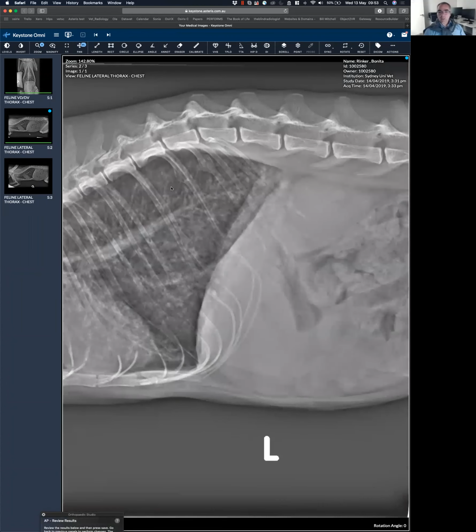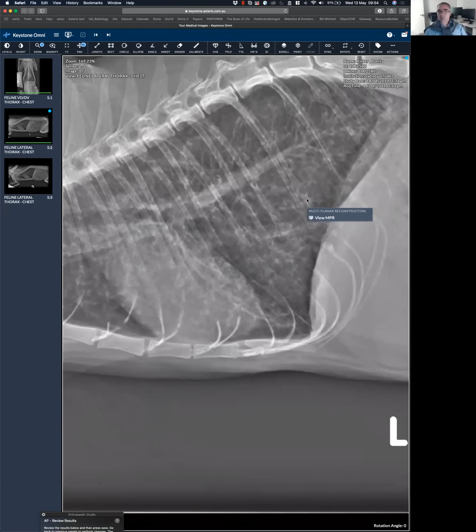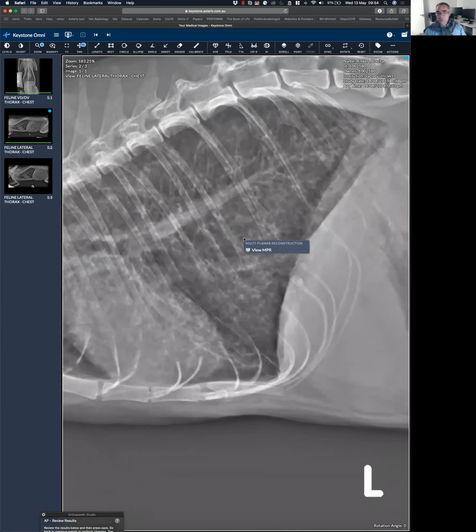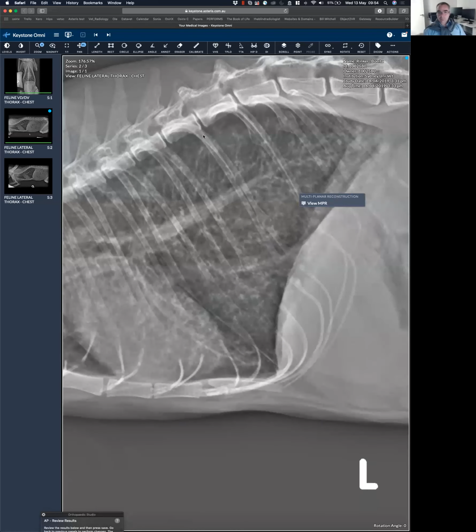Happy to go next time and go through lung or thorax a bit more because it's useful. So this is the mother of it. And I would always try to go to the periphery, try to pick an airway there. I would stay away from this area. So these are in a bad area, but they are small. That means that probably they are not in the hilus, they are more in the periphery, superimposed. But I always try to go similar to the Mets, go to the periphery.